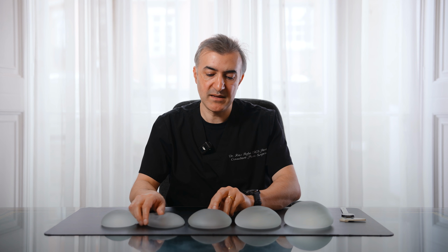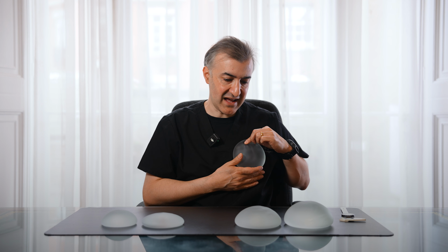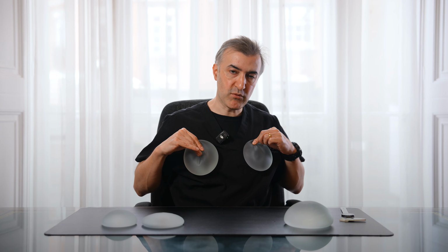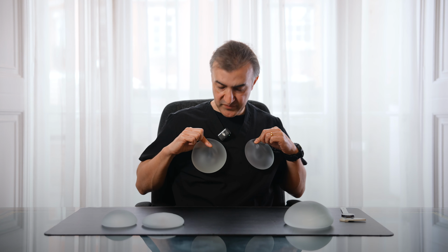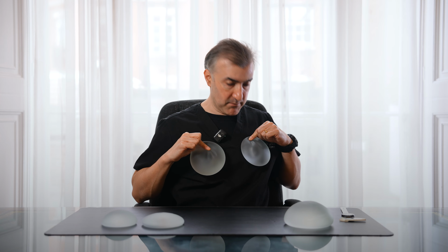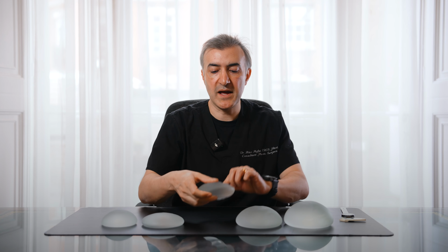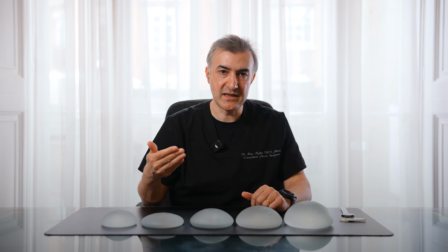So what I do is I would actually get patients to try them on. So they would be wearing a surgical bra, for instance, that's appropriate for them, and they'd actually put the breast implant in, and you would be able to take them through these, and they'll go, I like this one, or actually I like this one more. And you can compare 2 of the same on both sides, or you can compare, for example, a full projection with a moderate projection, and see, okay, which one do I like more? I get them to do that and look in the mirror. They may bring a friend with them who'd also give an opinion.